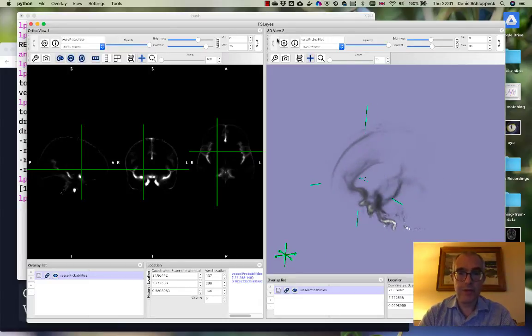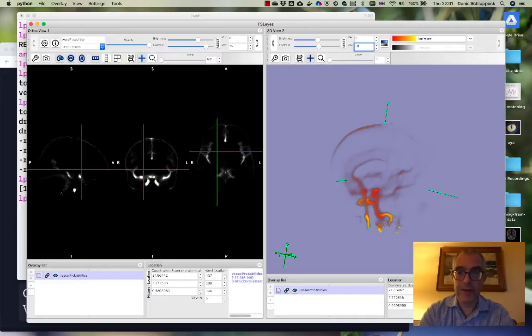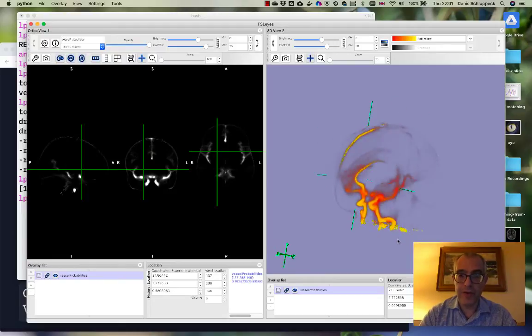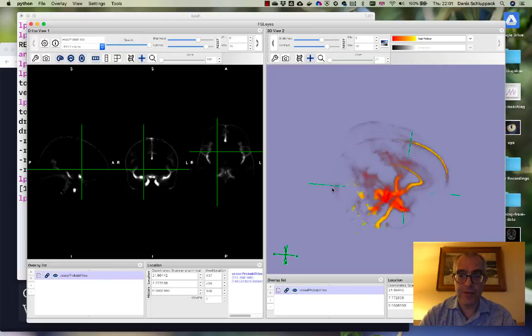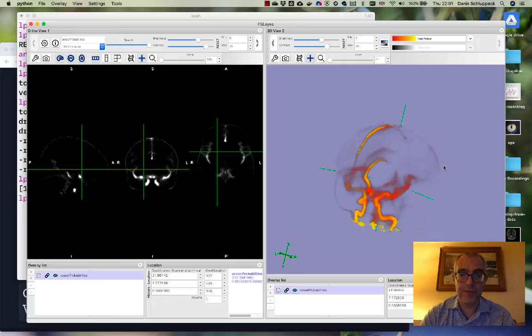Right. So that's already what I wanted to show you here, right? So you can take screenshots from here, of course. You can change the color maps. So maybe you don't like black and white, but you want to do orange. Change this back to maybe something more funky. So these are all things we can use potentially in the report writing, or making figures with several subpanels and so on, for giving an idea.